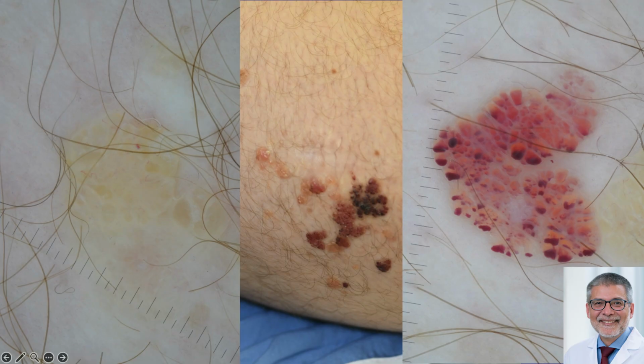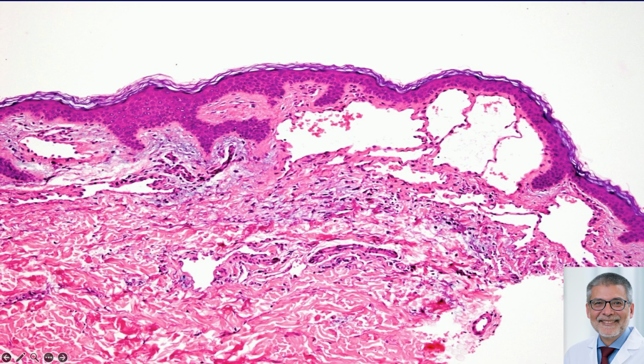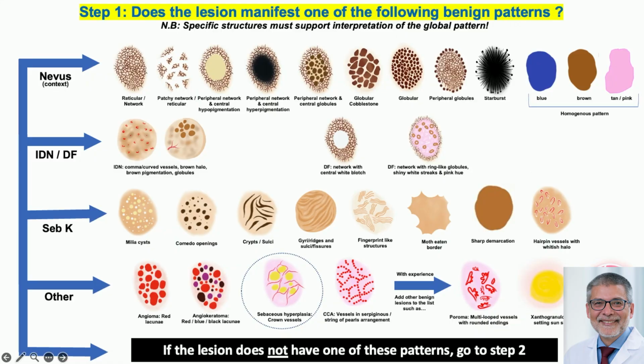And then when you have the clear spaces, this happens to be a lymphangioma, then you'll see just the clear lacunae as shown on the left-hand side. Sometimes you can have a mix between lymphatic and blood, and you'll see the blood level and the lymphatic level kind of layer out within the lesion. And that's highlighted by this lymphangioma and just the pathology of this lymphangioma.